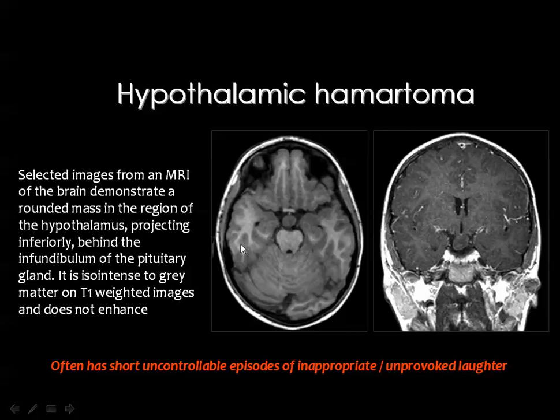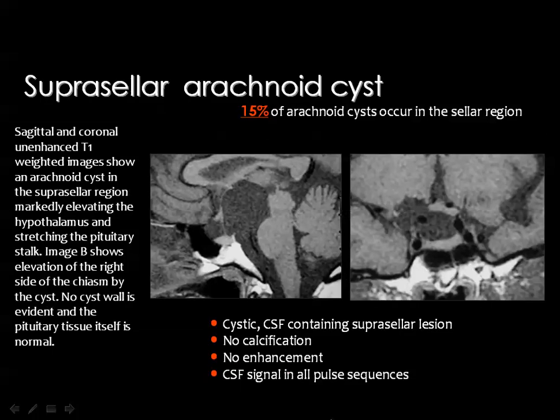And this is also another example, a lesion in the suprasellar cistern, and in the coronal image you see the lesion which is not enhancing. Of course, the appearance of the lesion in the sagittal images is better, because you see the tuber cinereum better in the sagittal images.